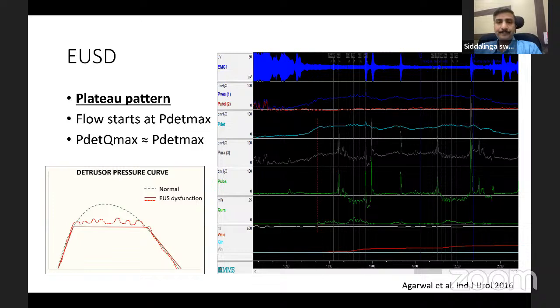But if you can find this phenomenon like the plateau detrusor pattern during your voiding phase, and if the pressure has not gone high, it is not meeting criteria of a normal bladder function like DCI is less than 100, and typically the BOI is not 40, it is going low only. But if you can see this plateau pattern, you can say with almost 90% certainty that it is a patient who has dysfunctional voiding, which means either the pelvic floor or external sphincter is not relaxing properly.